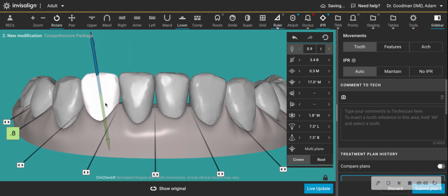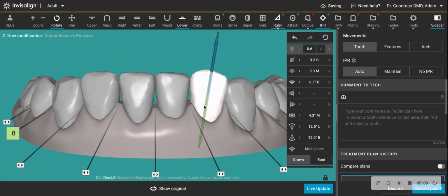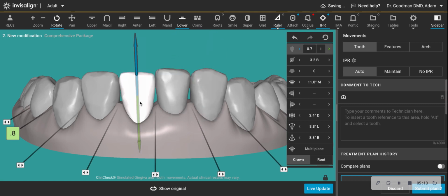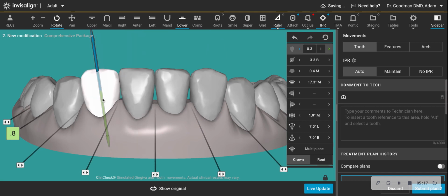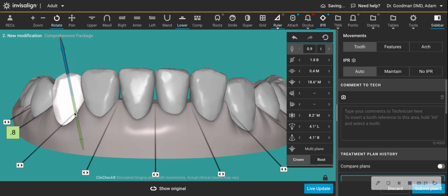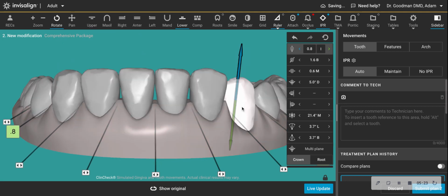So I'm asking the aligners to do less in this case. This is an adult, and I've removed some of this intrusion. I'm still going to get those teeth straight, but I really want you to see what's going to happen with the overjet when I do this. Canines I'm going to raise up too. So I'm asking less of this ClinCheck.